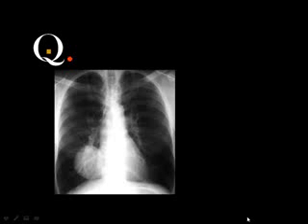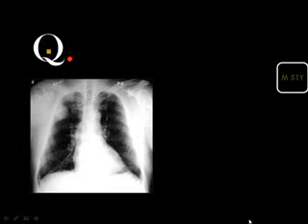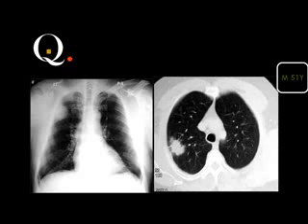Mass. And you need the CT scan to know if it contains water or not. And this is the CT scan. Yes, hydatid cyst. Very good. Nodule, mass, patch, cavity? Nodule. Nodule, tuberculoma. Okay? Or you should have a CT scan. Tuberculoma. Or CT? CT. What do you think?